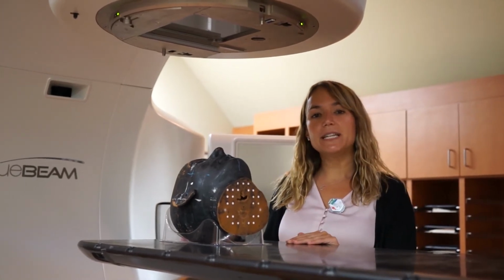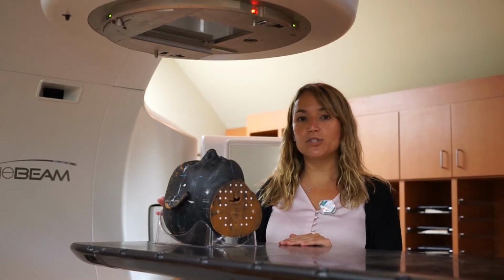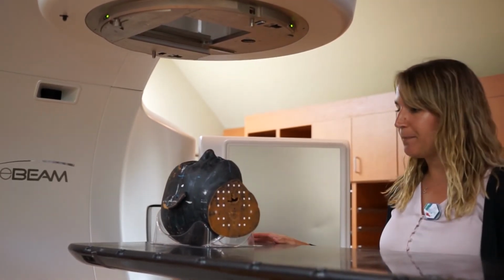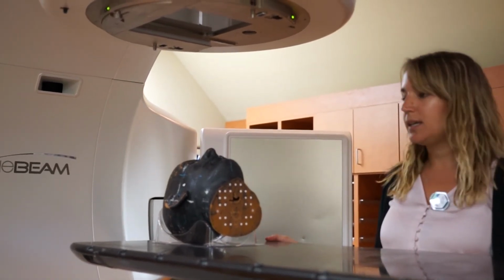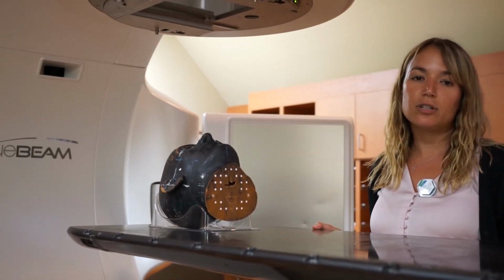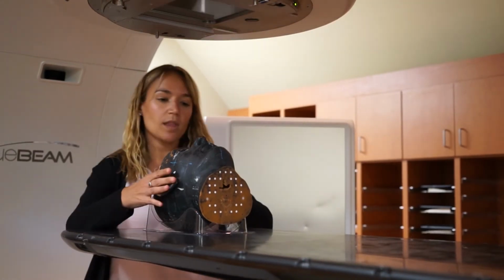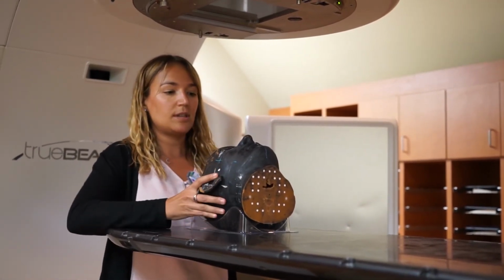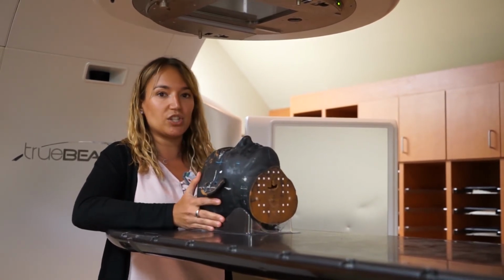Just to reiterate the translational and rotational names when you're talking about patient position, I am going to go through it one more time. So the up and down is the vert, the in and out is the sup-inf, and lateral is just lateral. For the rotations, this rotation is a roll, this rotation is a pitch, and this rotation is a yaw.